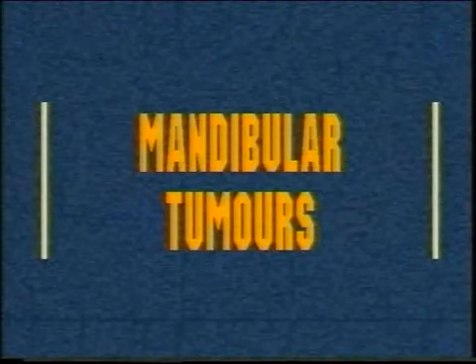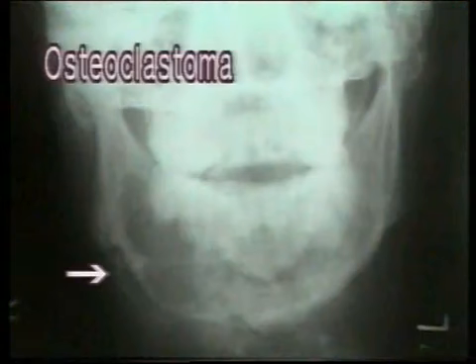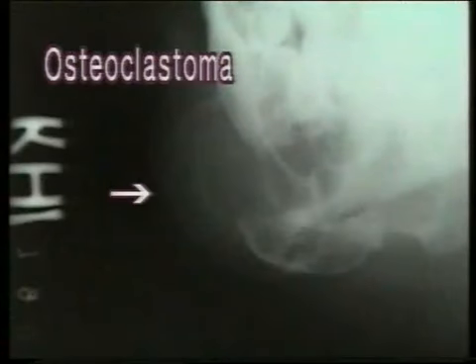Mandibular tumors. This is an osteoclastoma or adamantinoma of the mandible. Note the osteolytic areas with thin septae giving a typical soap bubble appearance. This is a lateral view showing the thinned out cortex and the soap bubble appearance.